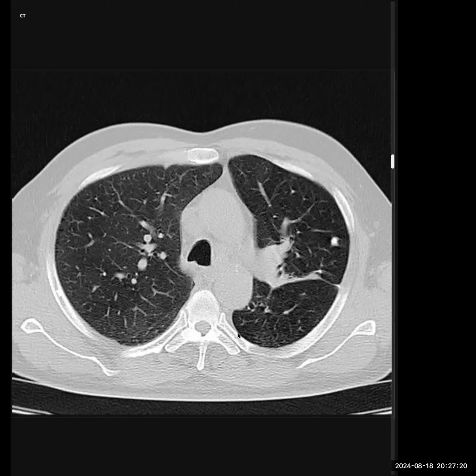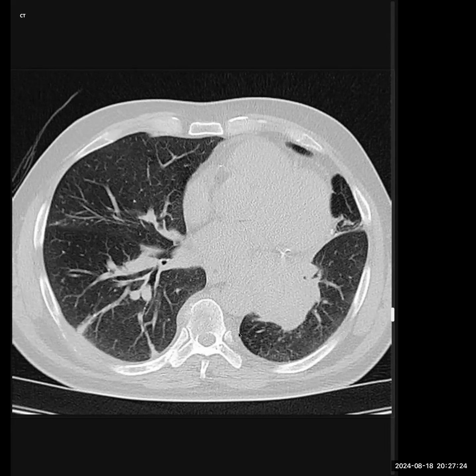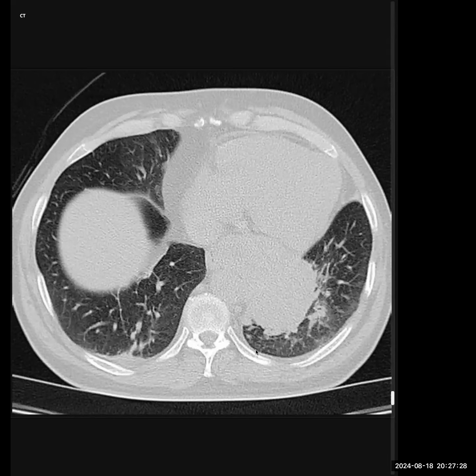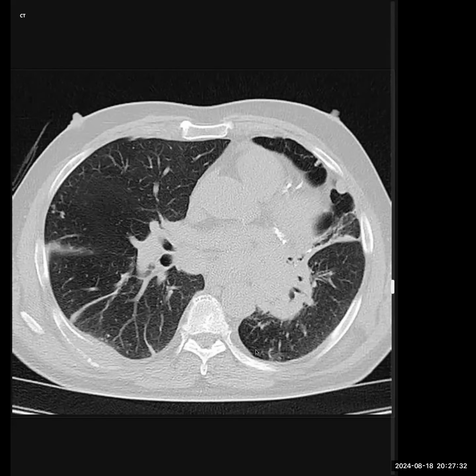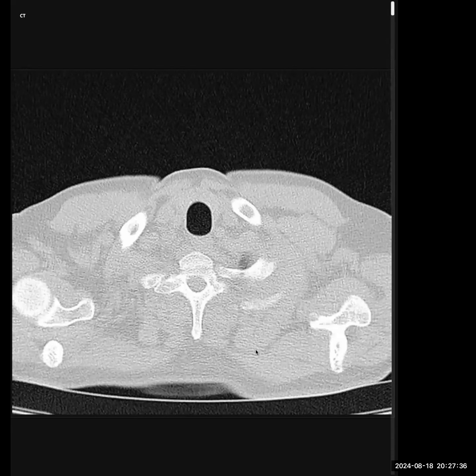Considering that this is an elderly patient with an ill-defined mass lesion with multiple nodules within the lung, I'm concerned that this could be a malignant process. I'm quickly looking at the bones to see if there is any evidence of lesions. I don't see anything in this scan.